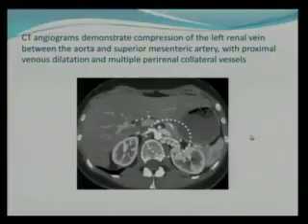What is this interval called? The name is very simple, it's called the aortomesenteric angle or the aortomesenteric space, like the name says. Usually they say if this is less than 0.8 centimeters, it is concerning. If it is above 0.8 to 1.2, it's kind of in no man's zone. But less than 0.8 is concerning.